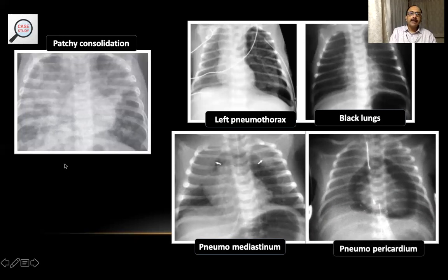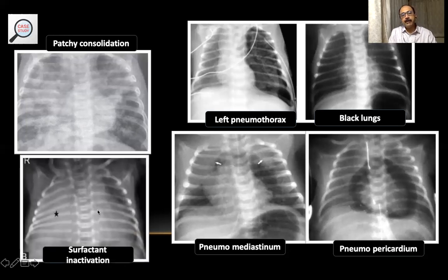So what starts as a meconium aspiration syndrome with bilateral lung involvement, complications that need to be anticipated are spectrum of air leak disorders in the form of pneumothorax, pneumomediastinum, pneumopericardium, and refractory hypoxemia, which can come as black lungs, what is called as PPHN. Now look at this X-ray of the same baby with meconium aspiration syndrome. What you find here is whiteout kind of appearance, telling us that there is hardly any air and the lung volume here is decreased.